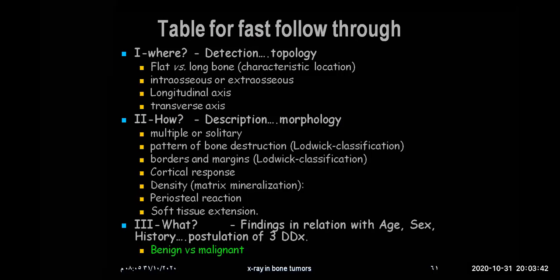After we revise all these, we want just to know, is it what? We want to know only to answer one question: is it benign or malignant?